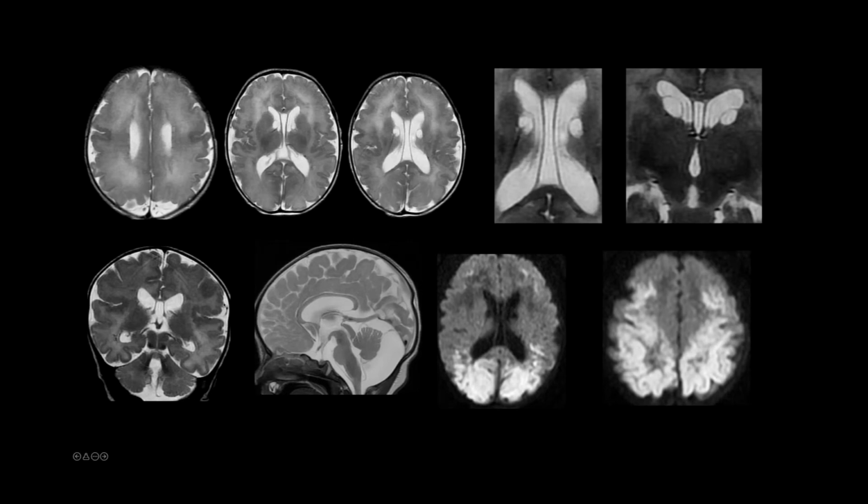Moving on to the MR images. I think one of the fellows can take it. Dashrath, do you want to take it? Okay, I'll go ahead. So you can see there are bilateral abnormalities in the perisylvian region extending up to the frontal and parietal lobes.